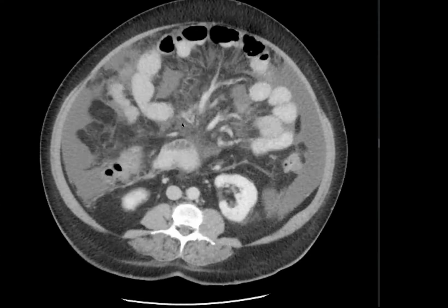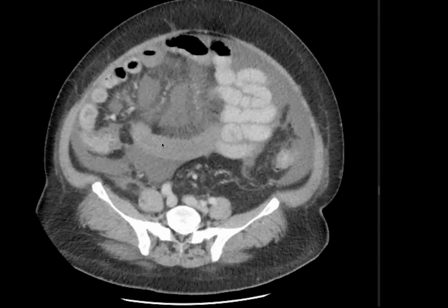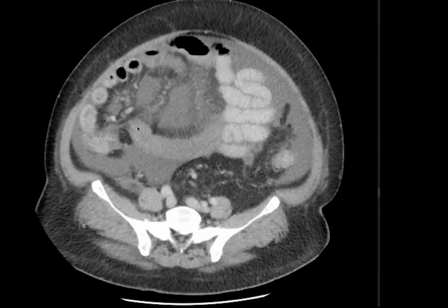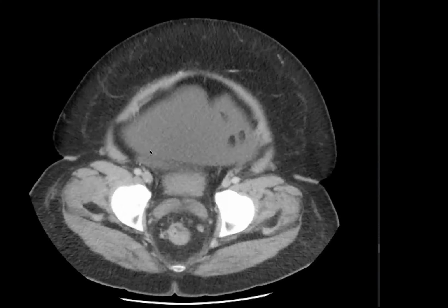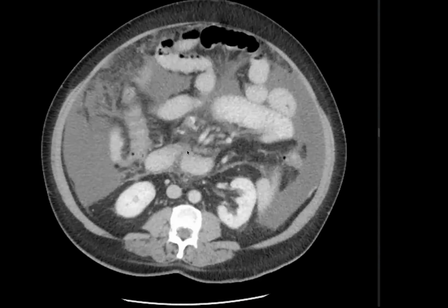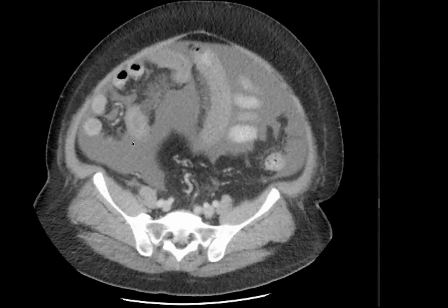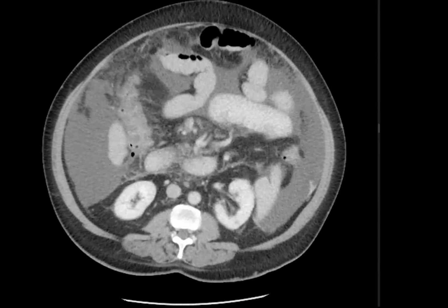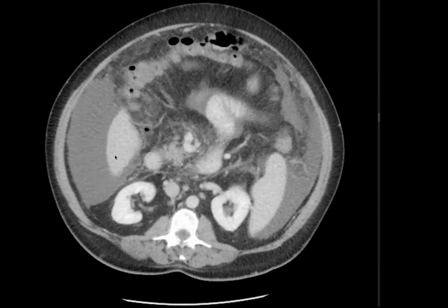Even if you don't see the thrombus, that is fine. If you raise the suspicion, even if you can't say established bowel ischemia, because I know there is no pneumatosis, there is no portal venous air, even if you say I'm worried about it, there is impending ischemia, and you express your thoughts that I'm looking for other signs of bowel ischemia, I'm looking for pneumatosis, I'm looking for free intraperitoneal air, I'm looking for portal venous air. As long as you go in the right direction, you will receive help from the examiner, because they're allowed to help you as long as you demonstrate that you are being very safe and thinking in the right direction.